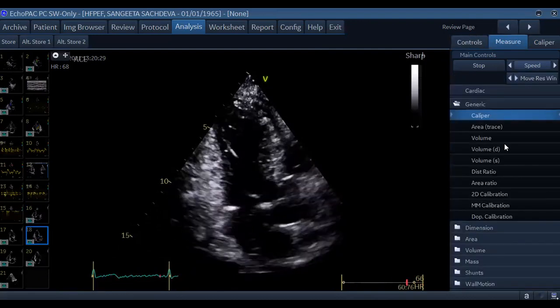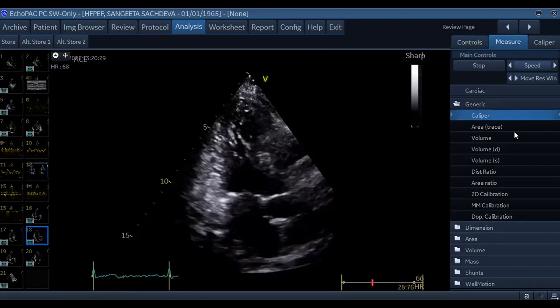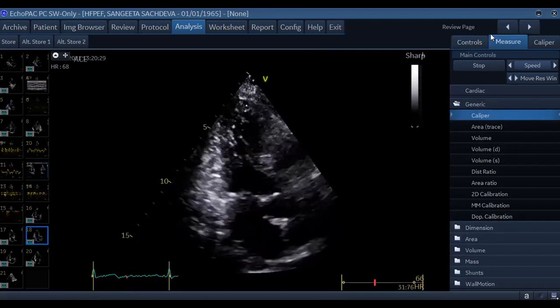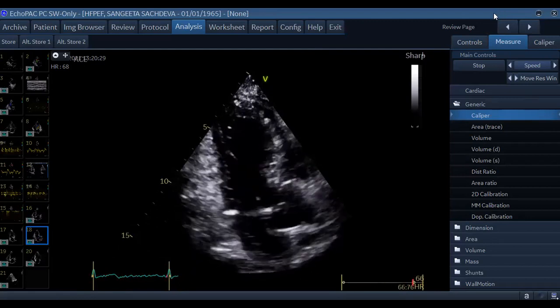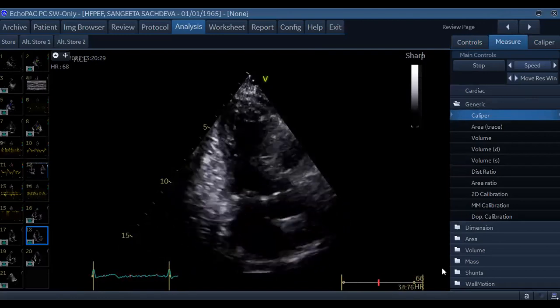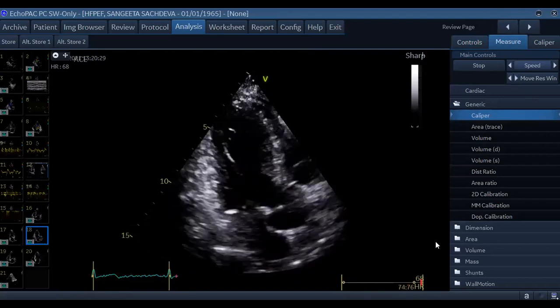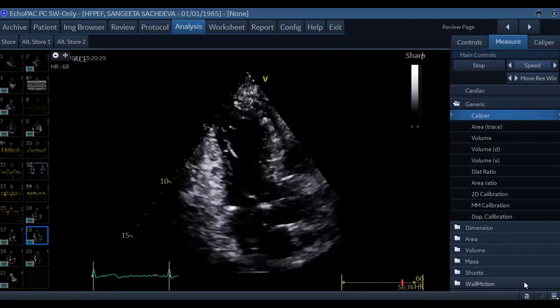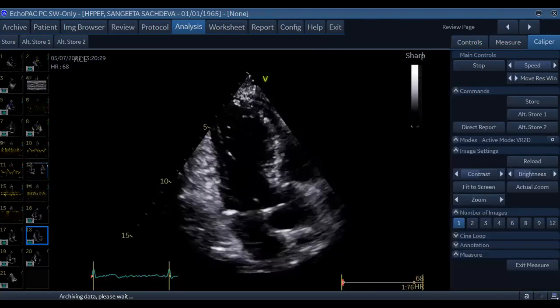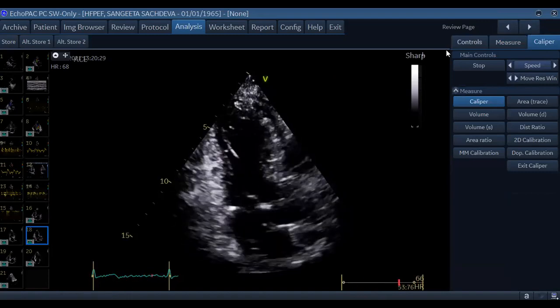So we go to, let me just look whether I'm able to get this speckle pattern over here or not.